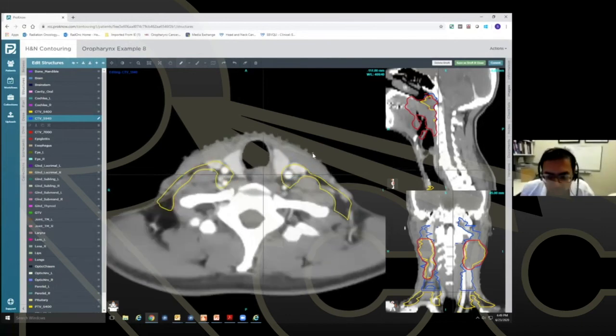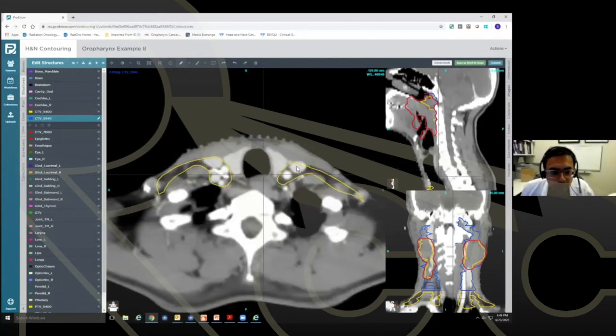Now going down to here, again, anterior border, right? Now we're getting into the low risk neck. We want to include up to the SCM right here. And it almost looks like a little sliver or a little finger pointing. Mm-hmm. Maybe you got it. Yeah, I can draw that right here, right here. Okay. Yeah, in the yellow. Oops, I used the wrong, but the yellow. I can maybe delete this, right?